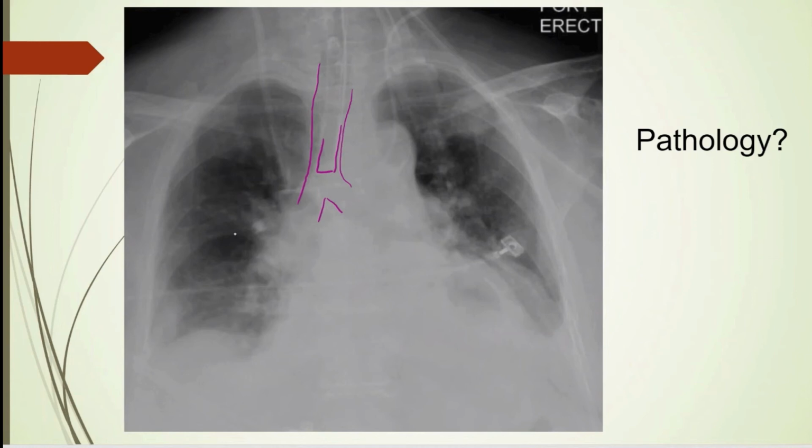B for bones, kind of difficult to see here, the ribs, a little underexposed, I would say. Okay, I don't see anything. Cardiac silhouette, again, difficult to see. So, looks like the gastric bubble, looks like this diaphragm, this is just a mess here.